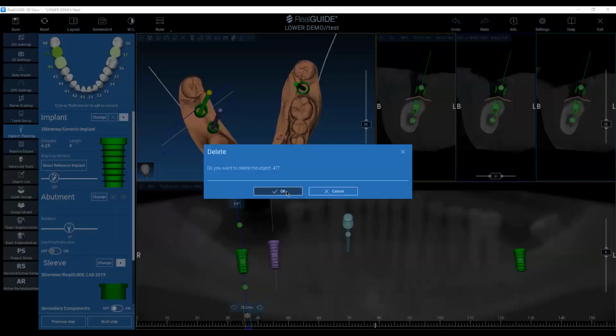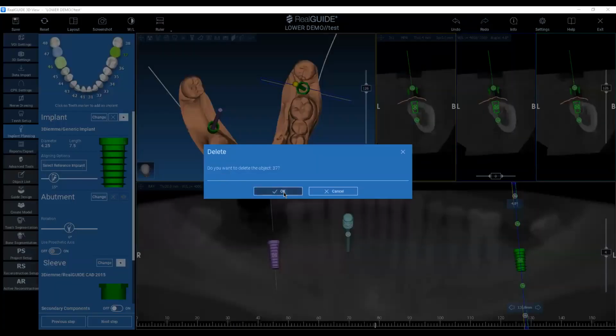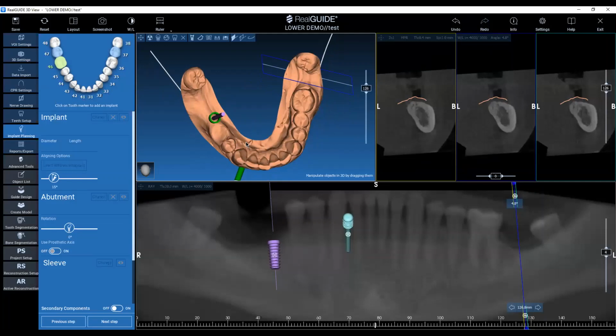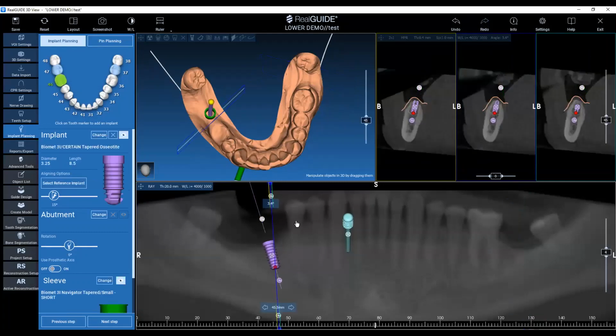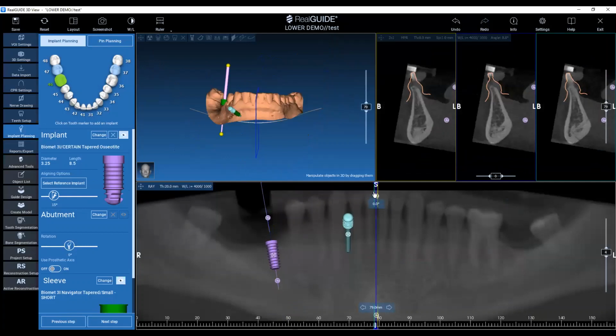So okay, you are now here. If you can show another question that they asked, how to change the angle position of the implant axis in the CPR view. So here I just need to click on the center of the implant and drag the implant with the icon arrow here. I think also the implant plane. So the plane. Okay, so the same thing in the blue.